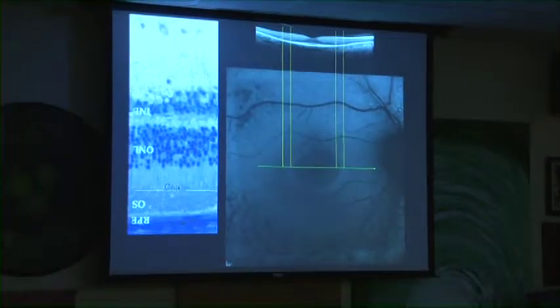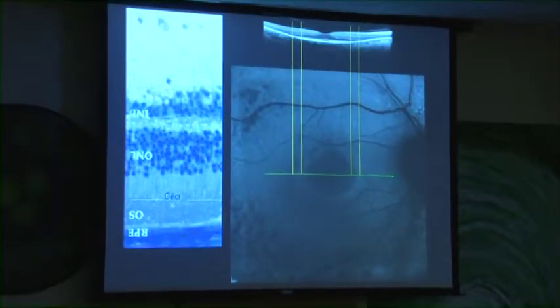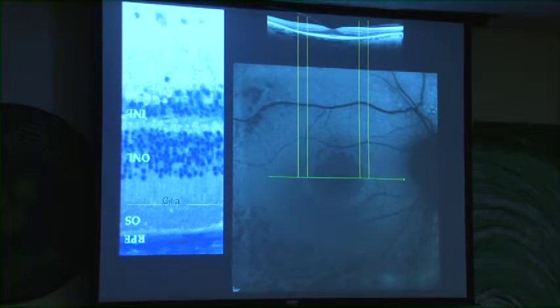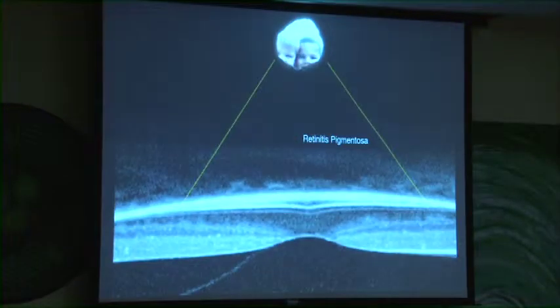Density ring, and then the so-called cilia, the ellipsoid, or the inner segment, outer segment junction, as highlighted here. So this is the cilia of the ellipsoid, inner segment, outer segment junction, corresponding to this high density ring. This is highlighted to you. This is the inner segment, outer segment junction, or the other name is the ellipsoid, or the inner segment, as shown here. So this corresponds to what I was showing to you, this area where the action occurs.